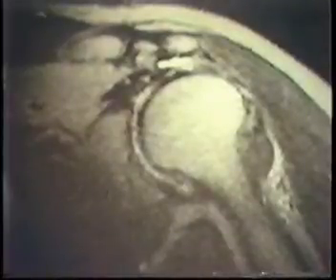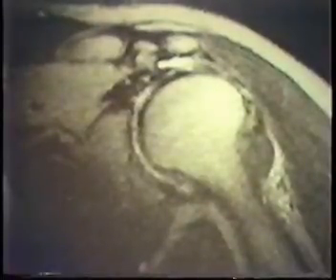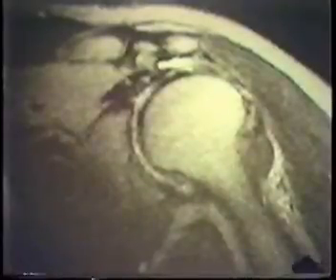And I think another way to do this would be to just do T1 weighted images through here and forget about the second echo, because this only helps in gross disease, but in gross disease you really don't need much help. So if it saves time on your machine to do just a T1 weighted image, I think you could just do T1 weighted coronals. But I think axials are very important in the shoulder.